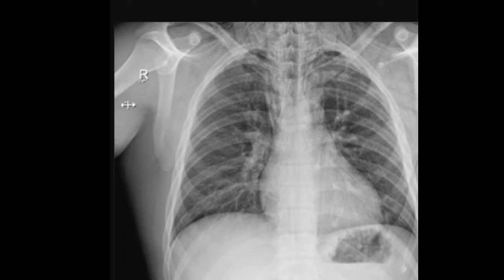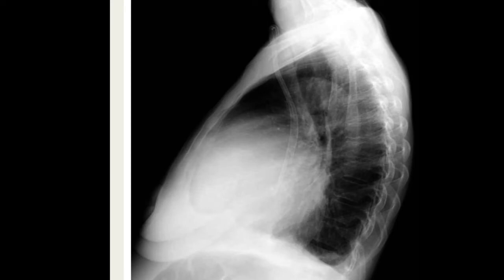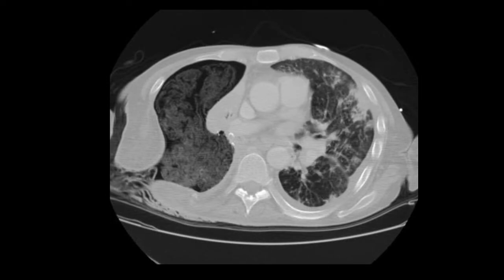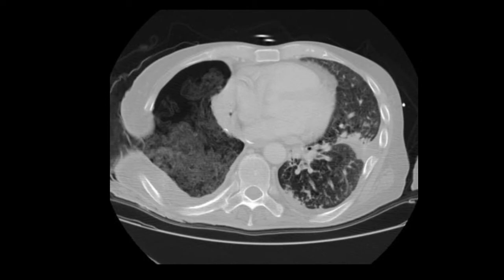We'll move on to our second case. Lateral chest radiograph, history is also chest pain. This is a CT thorax, and history here is going to be cough, productive cough. We have a few more slices. You have to keep in mind that sometimes the history helps, and sometimes it is not the most helpful.